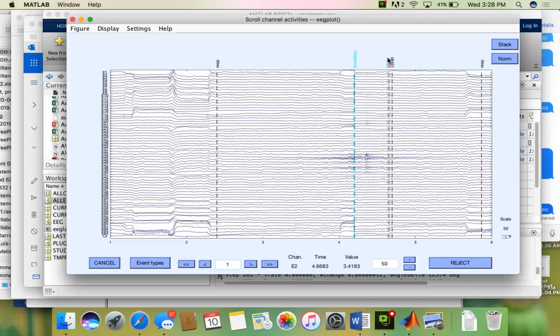Here you see begin again, and then you see 2HR. That is image number 2, a happy, real person. So M stands for mad, H for happy, S for sad, R for real, A for avatar, and C for cartoon.